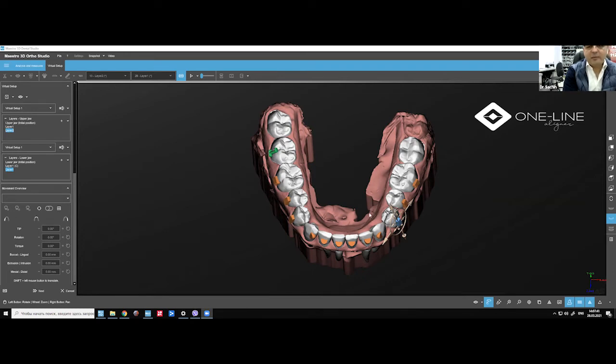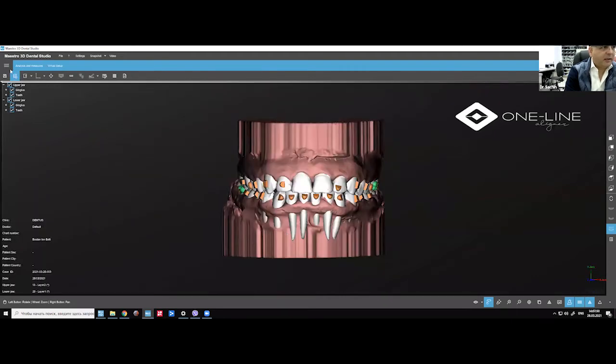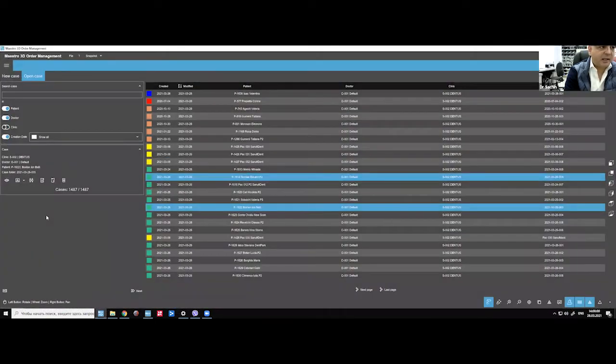So which other movement would you like to see? Okay, just let's see. We have a case where we're doing premolar extractions on the upper right now, a very difficult case. We are 50% through and we've almost finished that case.